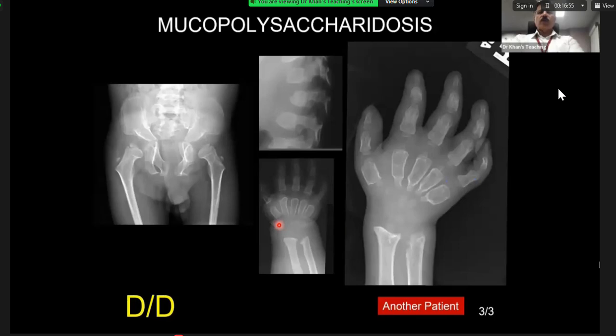So that is the only type of mucopolysaccharidosis which is important. Key findings for the exam are in the vertebrae. The vertebrae will be abnormal. They can be bullet shaped, as in this one. And there can be anterior beaking, which can be at the inferior edge or middle portion. And there can be various other non-specific findings. Epiphysis will be abnormal, metaphysis too. The long bones can have this tubular appearance. You got it right, that there might be subluxations here. There can be simian pelvis. With that, there will be fragmentation of the epiphysis.